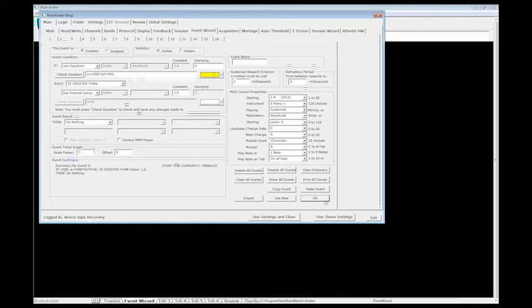Event 3, again, is still a scale factor of 3, offset of 0. Now Event 4 changes. For 4 we have a scale factor of 100 with an offset of 0, so that one is going to be looking at a range of 0 to 100, as well as Event 5 being in that same size. What that means is if we stacked these 3 events on top of each other, they're going to line up perfectly. If I wanted Event 4 and Event 5 on there, they would not.